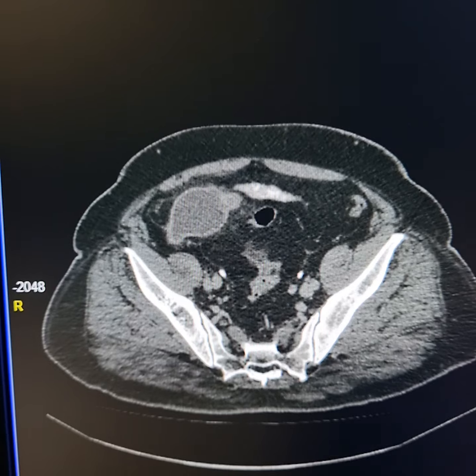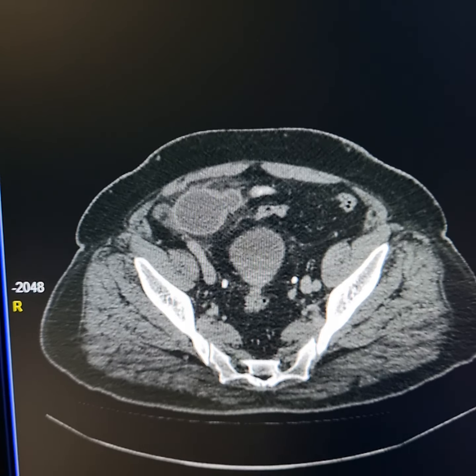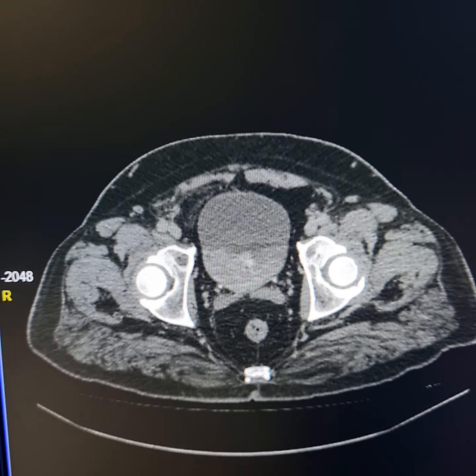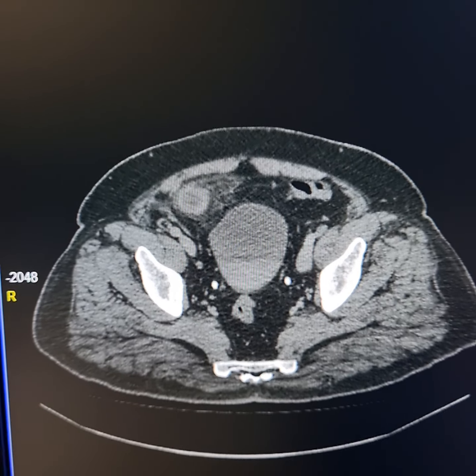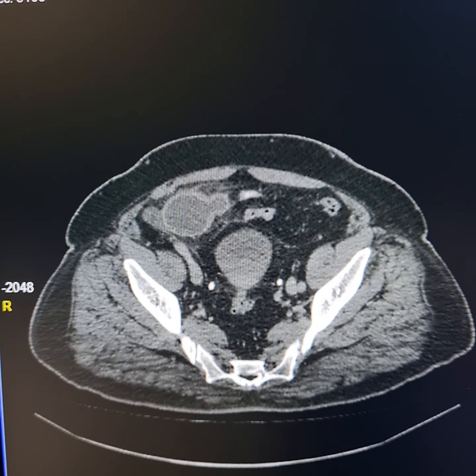While in this particular patient, the pain was not severe, and the patient was slightly tender to the transducer pressure on ultrasound. But operatively, this was also found to be an infected mucocele of the appendix.